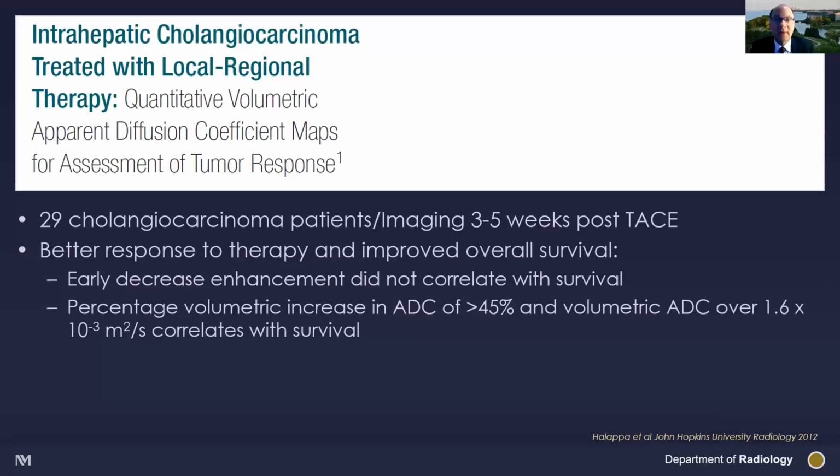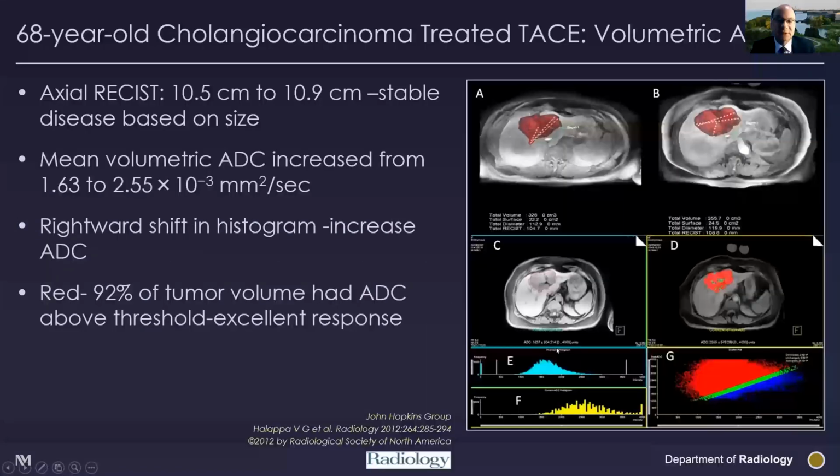But looking at that volumetric increase in ADC values, you saw that it did correlate with survival, whether it was over 1.6 or it increased by 45%. And here's an illustration where you can see the shift of the ADC values to the right, where they became higher values, that suggested there was going to be a good response and overall survival improvement.